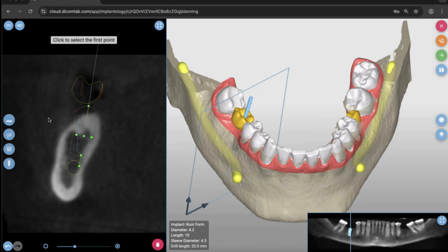It works with very, very similar logic. So I click again, and before the third click, I can see that this measurement tool is measuring my angle, and then you can see the result there. You can also get rid of it with another click on this icon. I have the undo button and the redo button, so whatever you do, you can always go back. Don't worry about messing things up because you always have the option to go back.